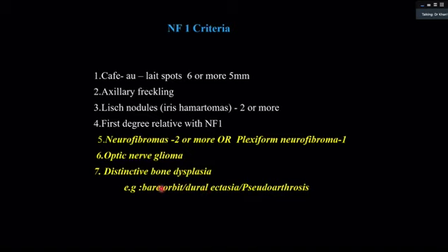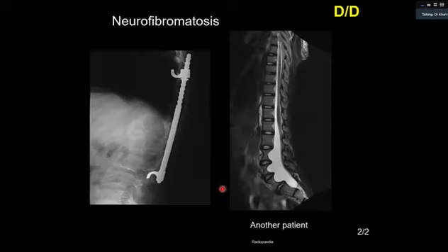Bare orbit, we will see in the CNS or head and neck module. But dural ectasia is what you were looking at. In dural ectasia, it is ectatic dura, simple as that, which can cause posterior scalloping. And sometimes, I'll show you later on these films in CNS, they are synonymous with the term pseudomeningoceles. They might also be going laterally into the neural foramen.